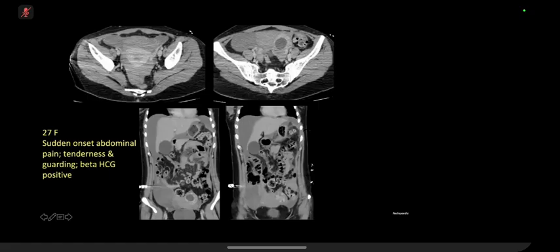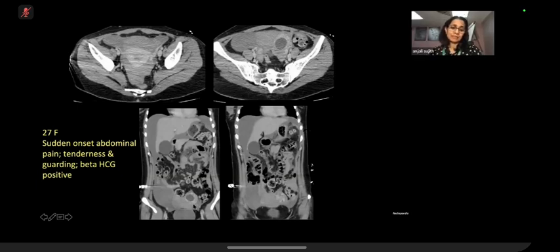Okay, so there's widespread free fluid with an impression of hyperdensity. So I'm concerned that that's hemoperitoneum, and in the left adnexal region there is a hyperenhanced cystic lesion with hyperenhancing thickened rim, which you would imagine could be like a rim of fire kind of appearance. And if there was no evidence of an intrauterine pregnancy, then this is highly suspicious for a ruptured ectopic. That's good. And I would urgently call the gynae.